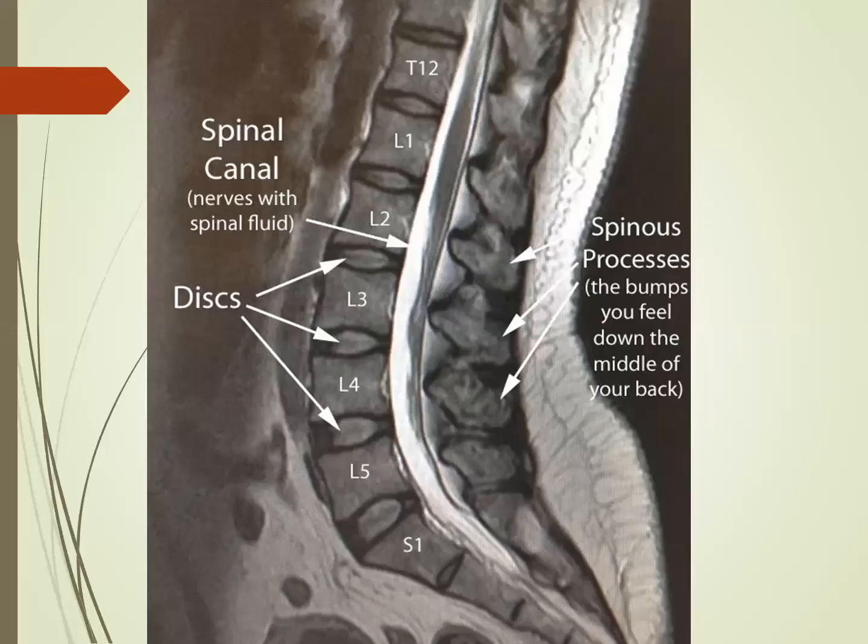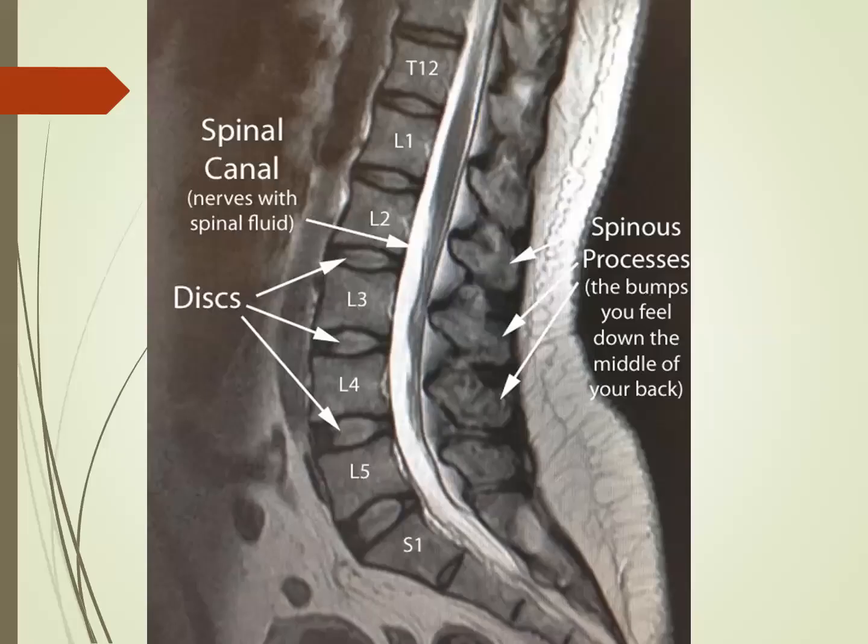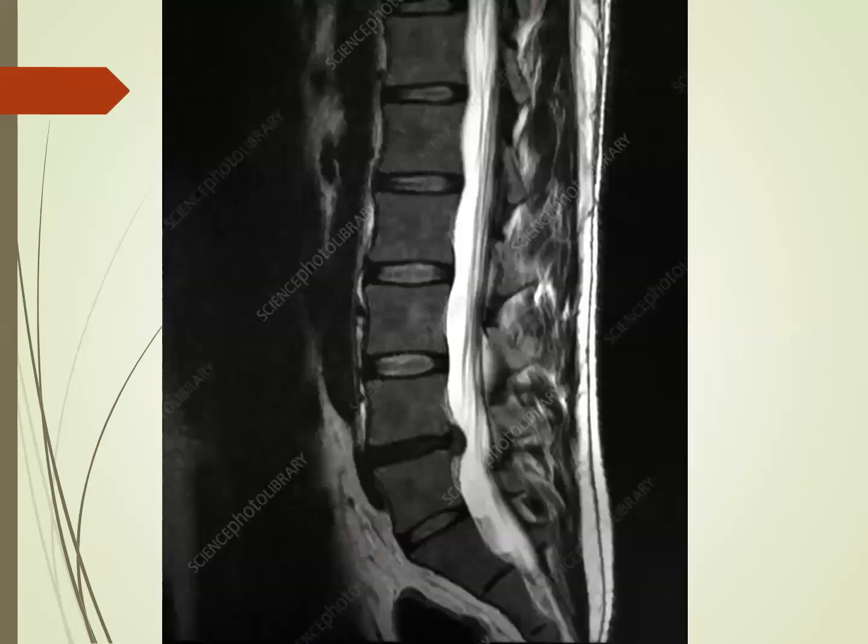So continuing from where we left, again, these are the MRI sequences which we discussed. Again, this is important to identify that these are the vertebral levels, and usually the color is whitish because of hydration, and once they become dehydrated, they tend to change the color, just like over here. A few of them above are in normal sequence, which tend to get blackened because of dehydration.